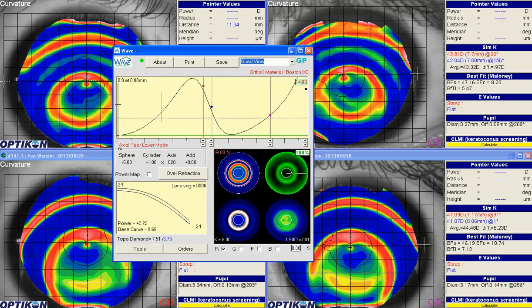It's the first click that gives us 0 clearance at the apex of the cornea. We'll check the edge angle here. We're already really close to 40, and 40 is what I start with as a standard. So it looks like we're at 40 right there.